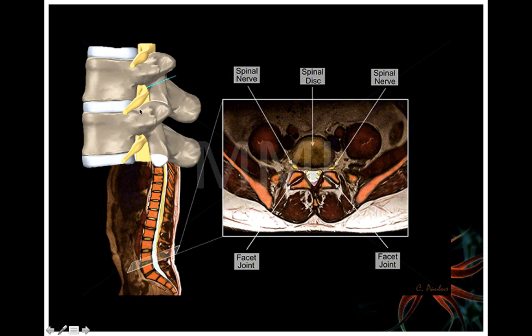And so the hole can become narrowed. Remember I just talked about narrowing of the spinal canal or the central canal. The holes on the side, where the nerve is going out, can be narrowed. If this hole is narrowed, it will cause impingement of the exiting nerve, in this case the L4 nerve, right? But let's think of a scenario where this hole can be narrowed. If the disc is narrowed because of degeneration, if this disc is not as thick as a normal disc, then the entire roof can collapse, so it can be smaller.